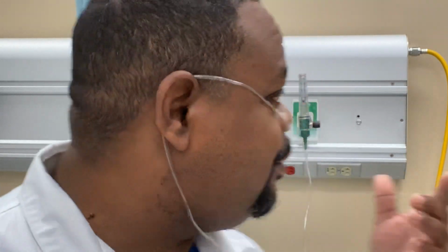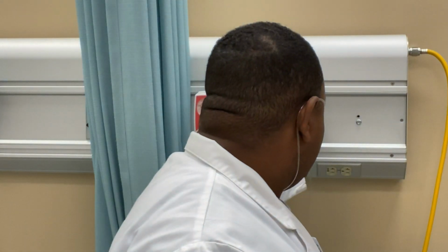Now, remember what we said. If I'm on oxygen and a nasal cannula, I can breathe, I get my oxygen, and I can eat. I can talk. It's pretty comfortable at low flows. Now, if I have it jacked up to 6 liters, it's getting pretty dry now, and I got it on like 3 or 4, right?